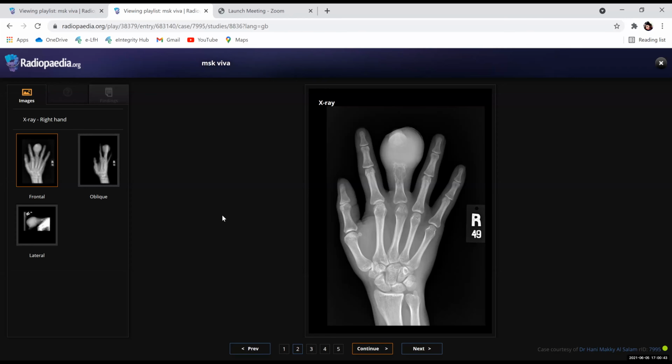It can be a tumor from the soft tissues, like a sarcoma. It can arise from blood vessels, from muscles, or from bone. What would you want to do next? I'll do an MRI.